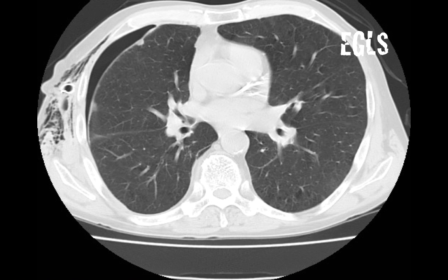Lung ultrasound has a sensitivity and specificity that approaches that of a CT scan. And we've found many quite big pneumothoraces, up to 40%, that were really difficult to see with supine chest x-ray, even if we look retrospectively. But it's easy to understand why when we look at the CT scan.